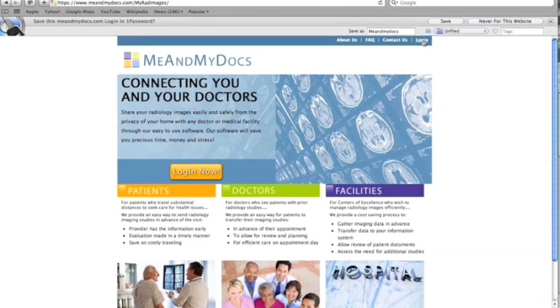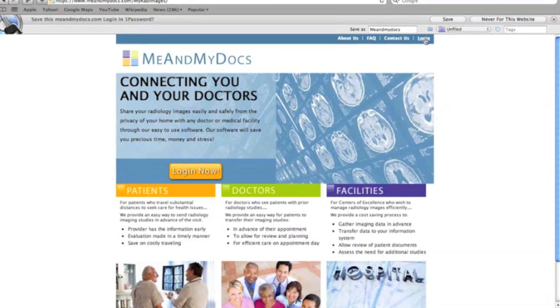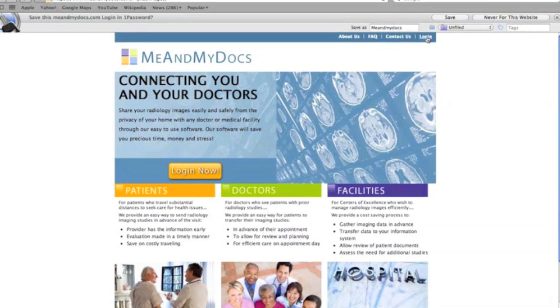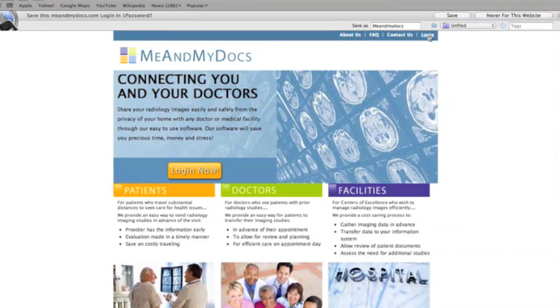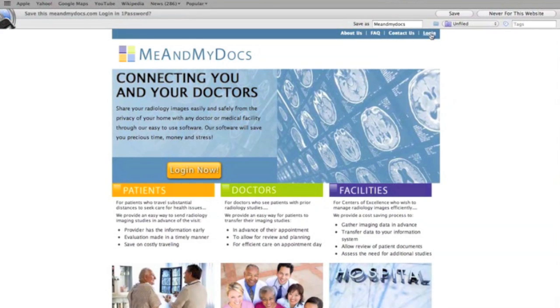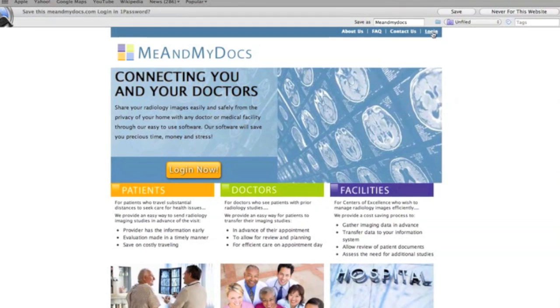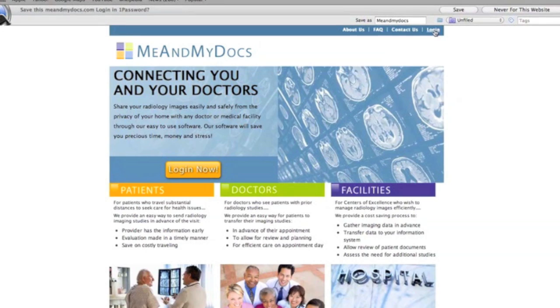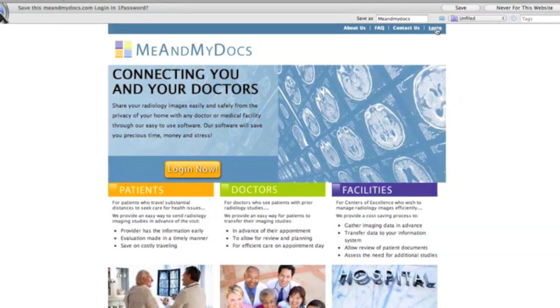This is a video tutorial for physicians, nurse practitioners, physician assistants, anyone who will be looking at these studies and then importing them to their radiology information system. So first we'll log in on the top right hand corner here, and then during this video I'll show you very briefly how a scheduler would send an invitation to a patient, what that patient invitation will look like, how the patient would upload their imaging studies from a CD-ROM, and then we'll skip to the part where you will look at these imaging studies, evaluate them, and send them to the radiology information system at your institution.